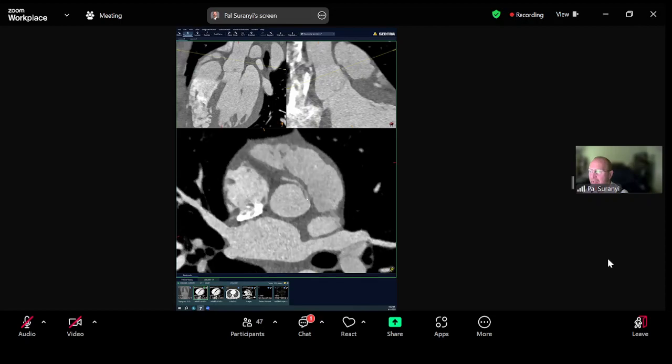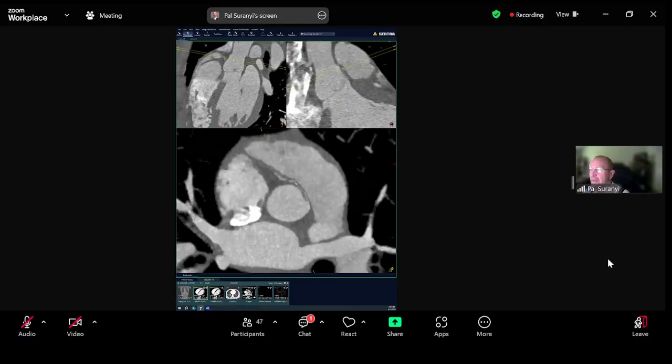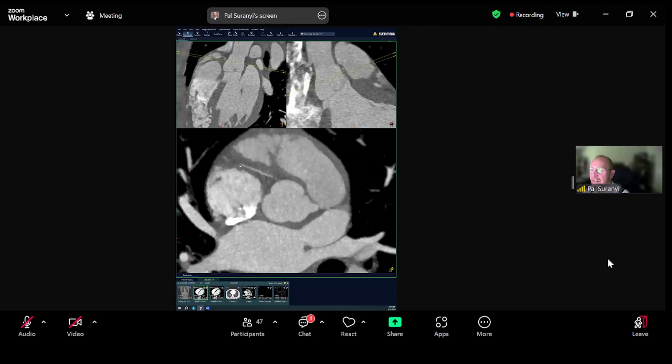It has a very narrow proximal course that's interarterial because it's running between the aorta and the main pulmonary artery. But not only is it interarterial, it's probably intramural, meaning it runs in the wall of the aorta itself. And then I'm going to use the trick that I think Dr. Glenn and Dr. Grafy both used to make it more enjoyable and prettier for everybody. So I'm stealing your tricks, gentlemen.